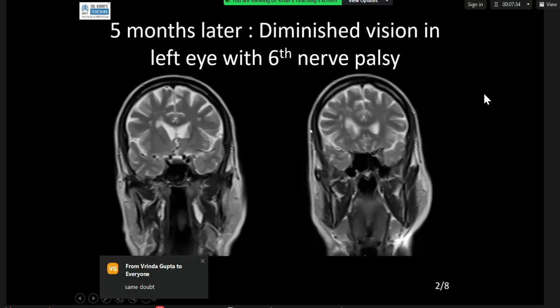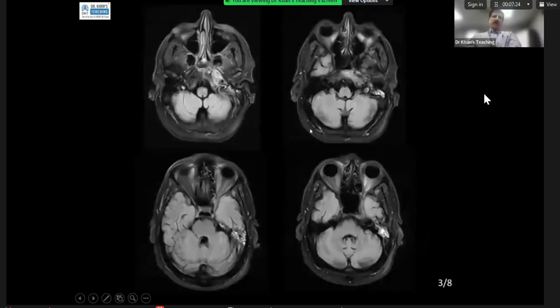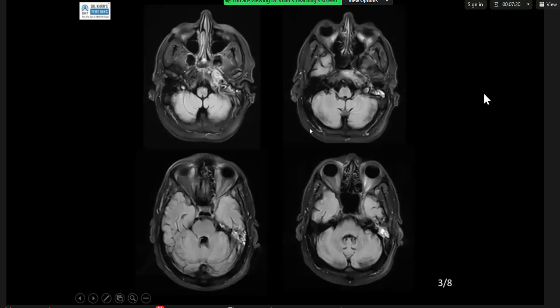I'd think about petrous apicitis with Gradenigo syndrome, where you get a 6th cranial nerve, abducens nerve palsy. Excellent, well done. What are your comments on this FLAIR sequence? I know that the abducens nerve supplies the lateral rectus muscle. Can you describe your findings on the FLAIR?